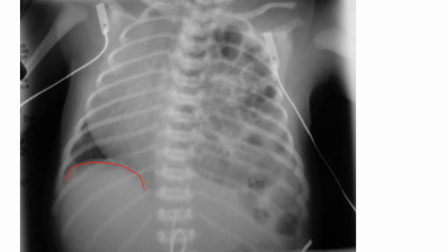If you were to auscultate on this baby, you would hear bowel sounds in their left side. This condition's more common in their left side. These are loops that I'm highlighting. This would be a congenital diaphragmatic hernia, a CDH. And that's where during fetal lung development, and we'll talk about this in the neonatal class, the bowel started to herniate through into the chest. It's more common on the left than the right, and then that's what's pushing the heart over towards the right side too, so the PMI would be shifted if you were auscultating as well.